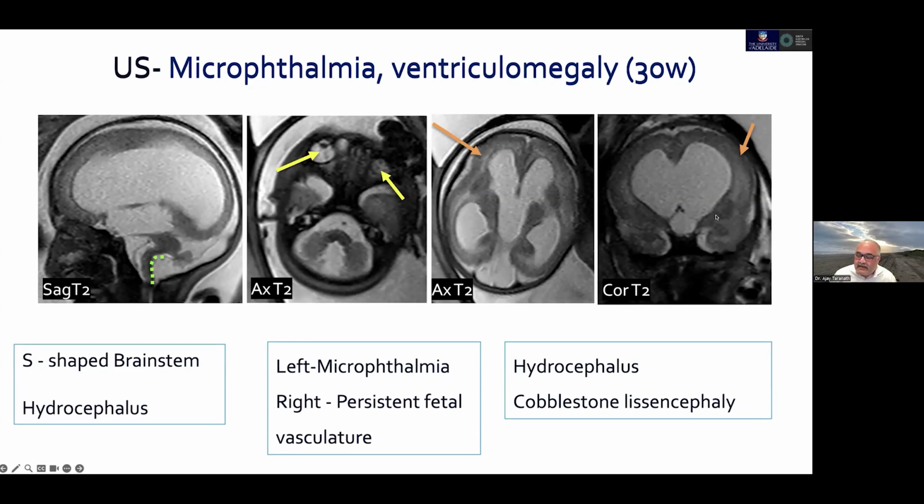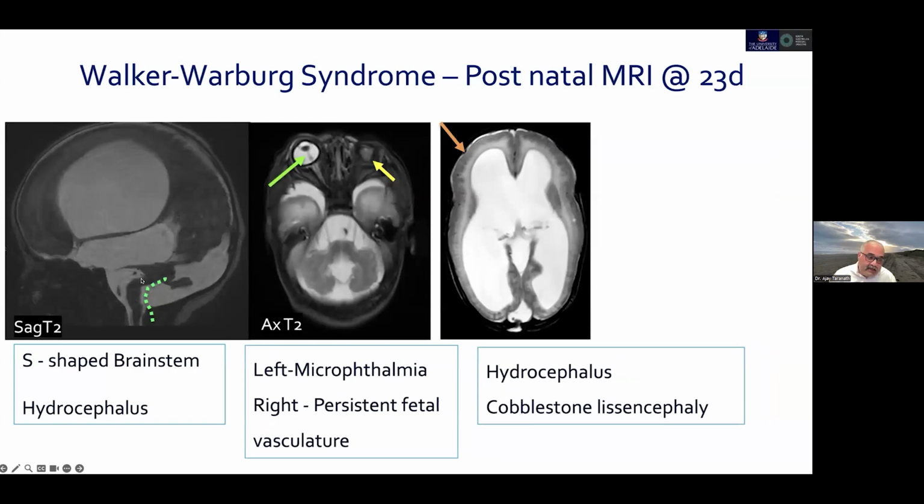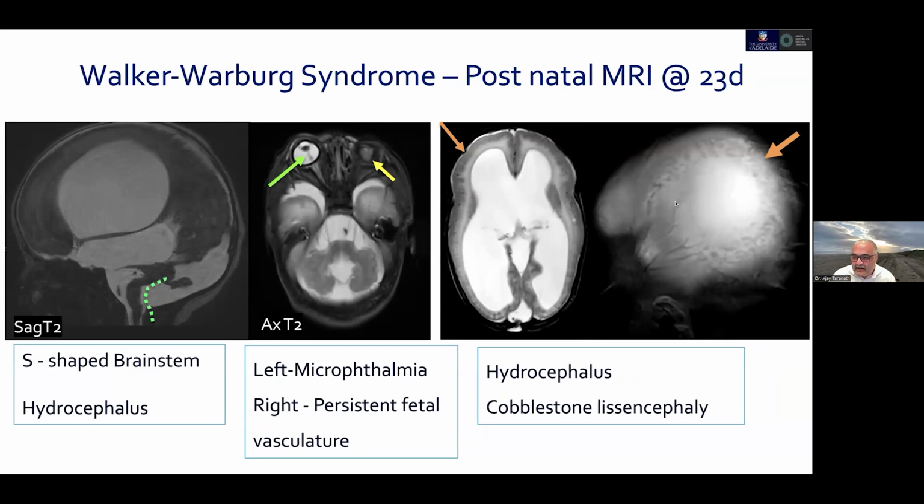You can see it there as well. The septum is not visualized, hence you have low fused fornices. Some people refer to it as the fornicial pseudonodule. And that's the postnatal MRI, which again reproduces all those findings that we saw. You can see the cobblestoning in the cortex bilaterally. And this is an extreme lateral image of the postnatal MRI, which shows those cobblestone appearances in the far sagittal plane as you are coming towards the surface of the cortex, where you can see those T2 dark areas.